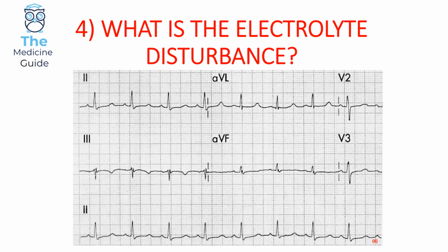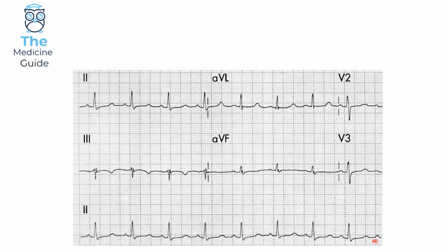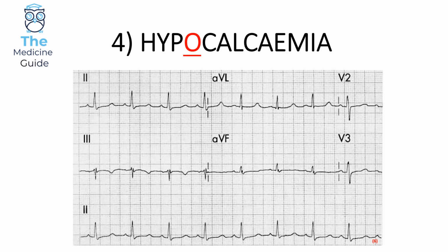So this is the next ECG, so I'll give you 20 seconds for this, or you can pause the screen, it's entirely up to you. Okay, let's find out the answer. Okay, so let's find out the answer of this ECG. So this is an example of hypocalcemia.